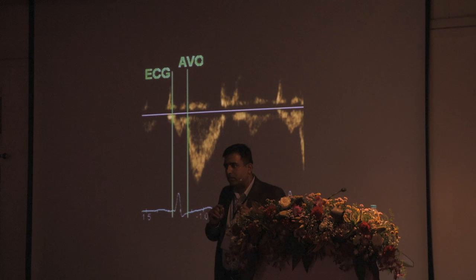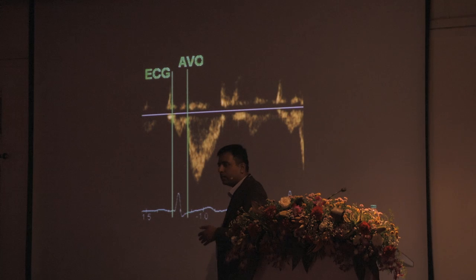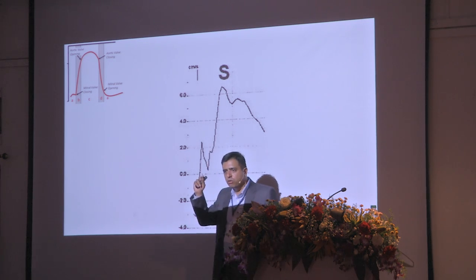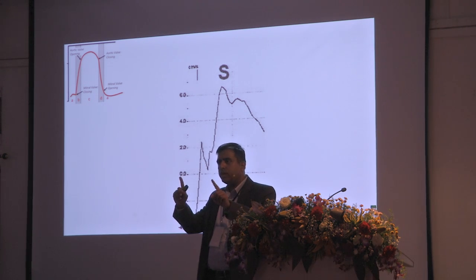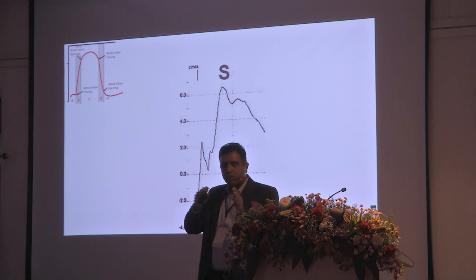However, this is an approximation, and this is something that you and I can do, but please understand we are as though transferring timing from one part of the cardiac cycle or some other cycles to our strain rate. I want you to know how to identify the closure of the mitral valve and the opening of the aortic valve on this curve without using those timings. If you know that, you can always go back and use the timings for the sake of convenience. So there are two ways to do timing. One is to superimpose the ECG with your Doppler and mark on your Doppler aortic opening and closing and mitral opening and closing. That is how all of us do it in day-to-day practice.